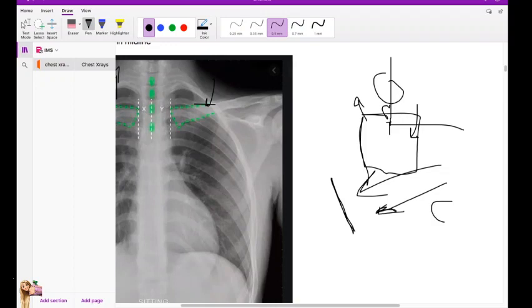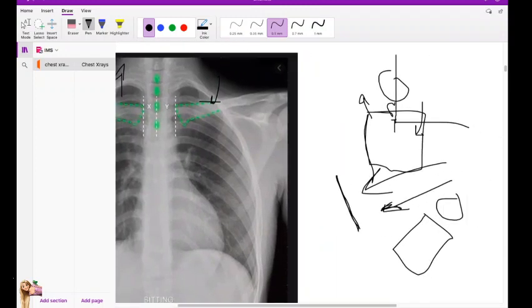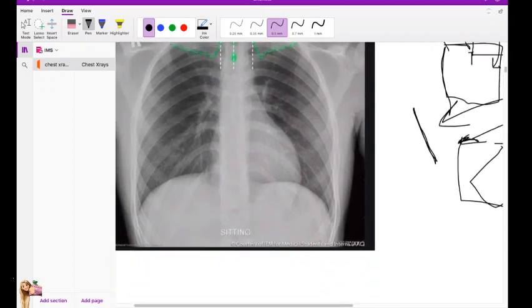And then the patient can just become like this, suppose. Even this rotation is not usually the rotation people talk about, but this is also a rotation that's possible. The X-ray will just be like that, and I think people just usually interpret it anyway.